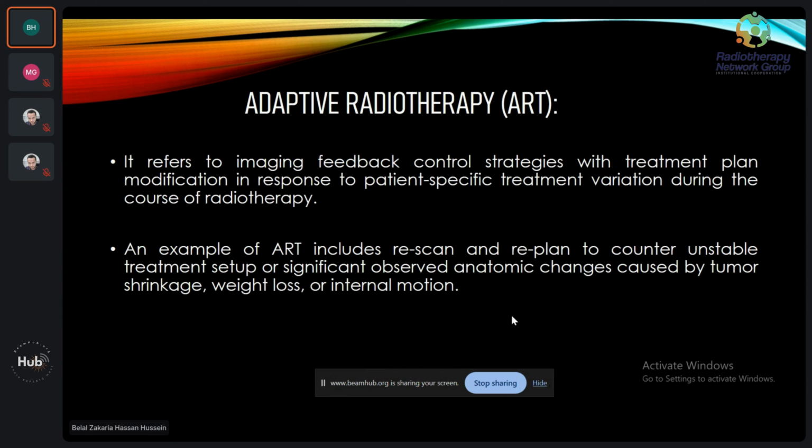Finally, I will give you some advice. For the nasopharyngeal case, during the patient's sessions, follow the patient setup and make sure the treatment delivery is good for the patient during all the sessions. Follow that with image-guided radiotherapy and the best image guidance, the CBCT. Please, if you build your plan, make sure to follow the alarm for the organ at risk.